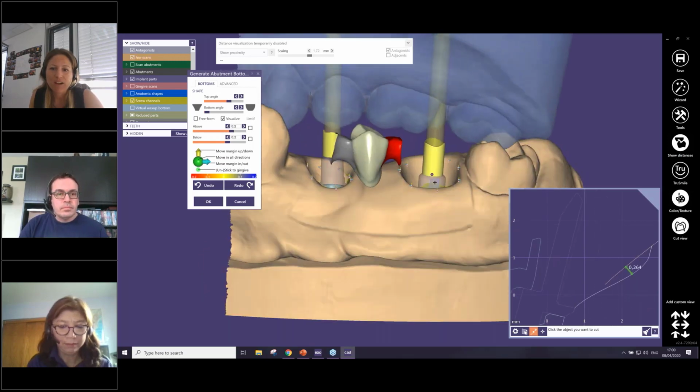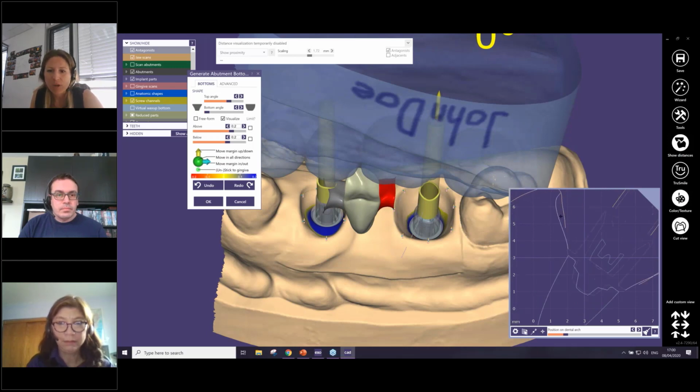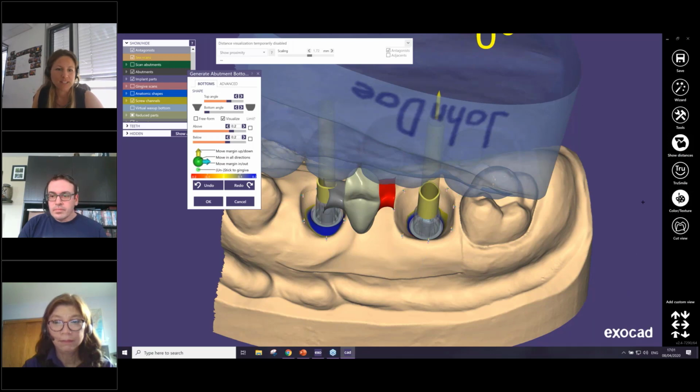This feature is really nice to use. You can go over it and check how much pressure you have with this cut view window. You can go through this scan or the mesh. It's over here, and here is the measurement tool also. I deactivated it again. I guess this is quite nice for measuring. You can measure everything and set a cut view anywhere to check what it looks like. This cut view window is really nice and good to use.